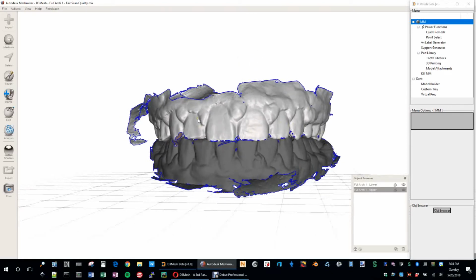Unfortunately, without getting into too much detail here, I'm not going to be able to keep these in the occlusion that they're in. But as I've mentioned before, in a future, very soon update, that will be a trivial thing to implement. So at that point, that'll be no problem. But for now, I'm just going to do them both real quick, and hopefully I don't talk too much, and can just show you how this puppy works. All right, let's go ahead and get started.